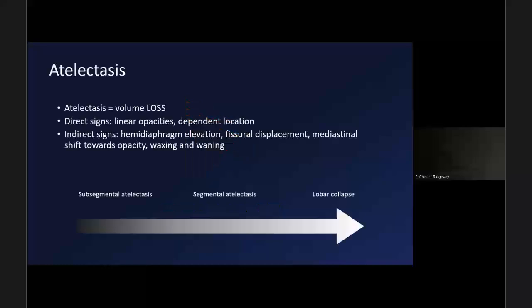So the first thing we're going to talk about is atelectasis. Atelectasis does appear as an opacity, white stuff on a chest X-ray, but what that stuff is, is volume loss, so alveolar collapse. You're going to see a range of terms that we might use that all describe varying degrees of volume loss. You can see minimal bibasilar atelectasis, meaning there's some like schmutz, some white, bright schmutz in the lung bases. That's just atelectasis, because honestly, we all have it. Unless you're like super, super healthy or have really bad emphysema and there's no lung parenchyma to collapse, you have a little bit of atelectasis.